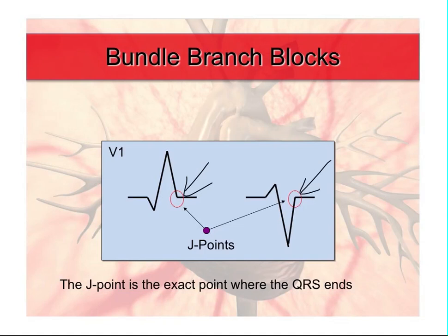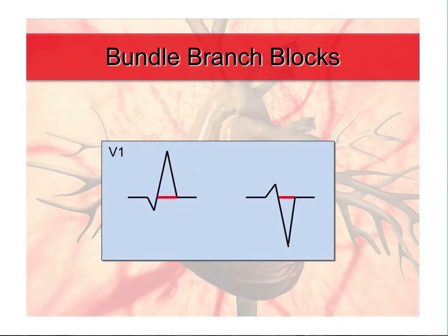Okay, and draw a straight line back from that J point. And if you want to, you could shade them in, kind of helps. And then which way is your arrowhead, so to speak, or your triangle, pointing? Which way are they pointing? Well, the one on the left over here is pointing up, and then over here it's pointing down.